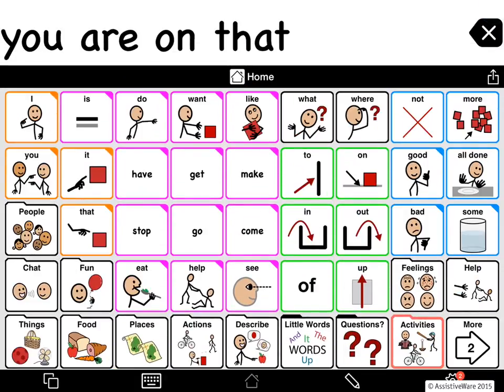Once you have a message in the message window, whether it has symbols or not, this is a great time to use that text to communicate with people at a distance. Proloquo2Go lets you use the text in the message window to email, tweet, send text messages, etc., or just copy the text in the window and paste it into another app on the iPad or iPhone. This allows someone to use Proloquo2Go to write in functional ways.